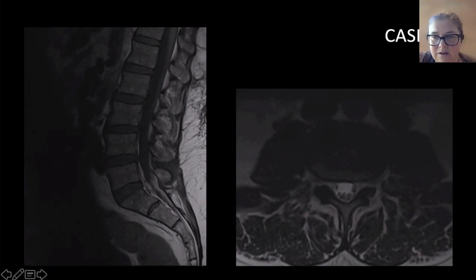But we're not just looking at these in isolation. You have to look around. So you look at the psoas muscles, the paraspinal muscles. These can be really important for if you have infection. So looking for myositis, bright signal in the muscle, or abscess. But look in the retroperitoneum, you've got these dark structures.